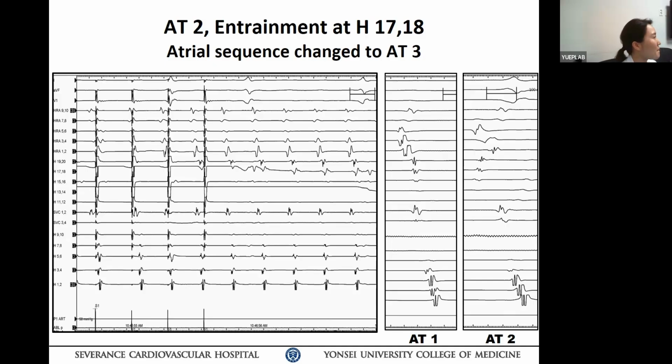So first of all, if you have this kind of tachycardia, you have to determine whether it is a macroreentry mechanism or a microreentry mechanism. If it is microreentry, just a point of ablation can solve the patient's problem. So how will you differentiate macroreentry versus focal, whether it is microreentry or the real focal? By entrainment.